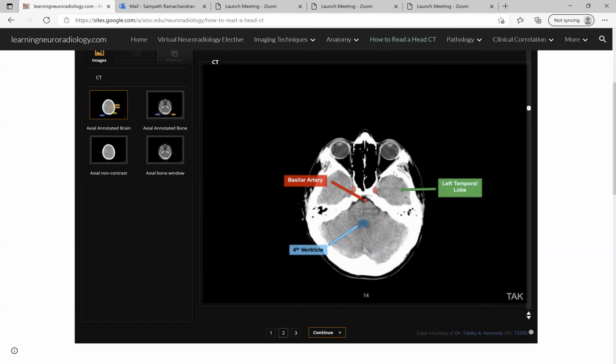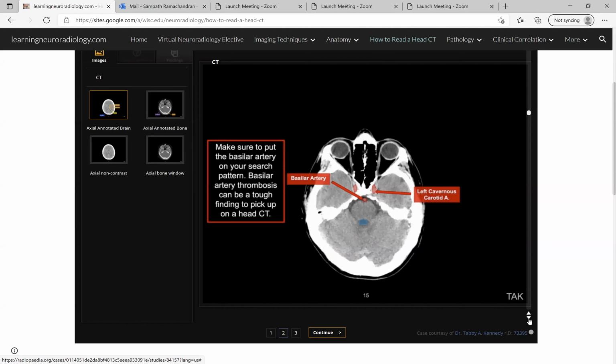And here we are coming into the bigger portion of the brain. You can see the inferior part of the temporal lobe here, which is the very bottom of your brain, essentially. And here's the cerebellum again, and you can see part of your brainstem, and part of the pons in the center, right here. Also pointed out is the basilar artery, which forms when the two vertebral arteries come together, from the basic anatomy point of view, if you can remember it.